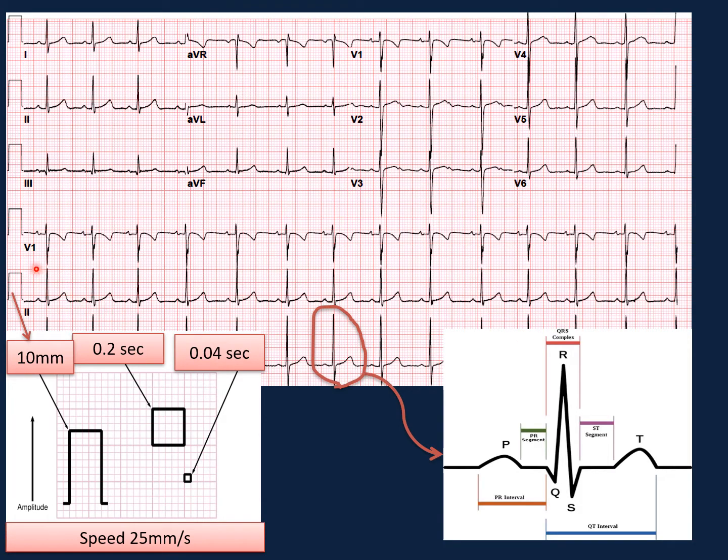When we look at the ECG, we have a 12-lead ECG, and we look at the rhythm leads in the bottom to look at the rhythm and rate. Then you have here the 12 leads. You have lead 1, 2, 3, AVR, AVL, AVF, V1 to V6.